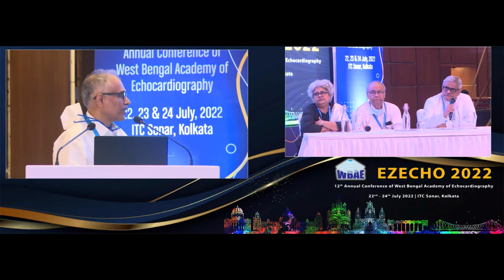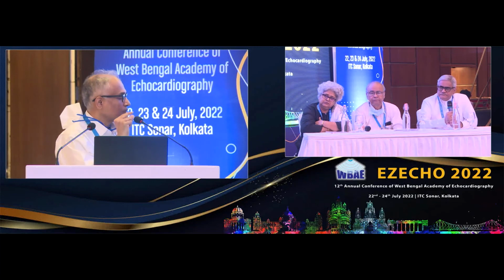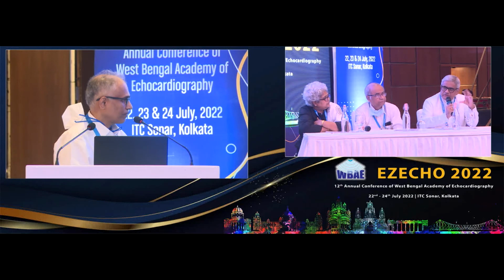To some extent, there has been literature data, studies published, on how tuberculous effusion looks, where you have more of a frond-like appearance and then loculation. That's how a typical tuberculous effusion looks. If you look very closely, the thickening of the exudates will settle on the pericardial layer, and it will look a little thicker. So those are the findings as far as tuberculous effusion is concerned. But when it comes to tissue Doppler, no, it is just to look at the hemodynamics which you want to establish.